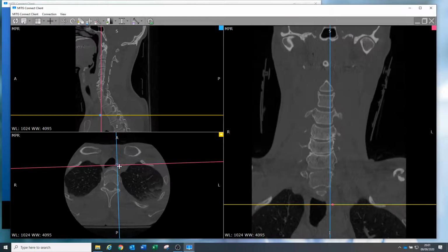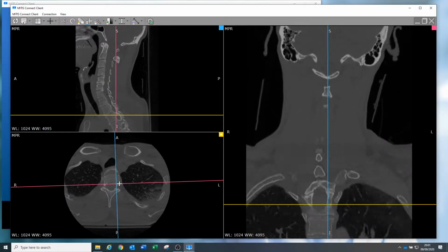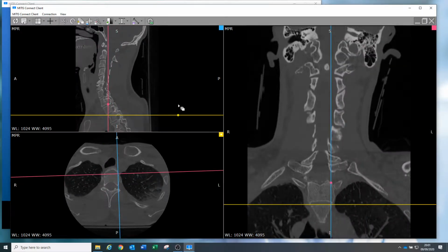Finally, bringing this demonstration to a conclusion, we can see that this has been heavily weighted on radiology and specific specialist use cases in a hospital. However, now that we're more comfortable with the MITIS application and what it does, you'll clearly see that this can lend its hand to other departments within the hospital, such as accident and emergency, wards, consultants, outpatients, and really drive that ability for clinical staff to work from home.